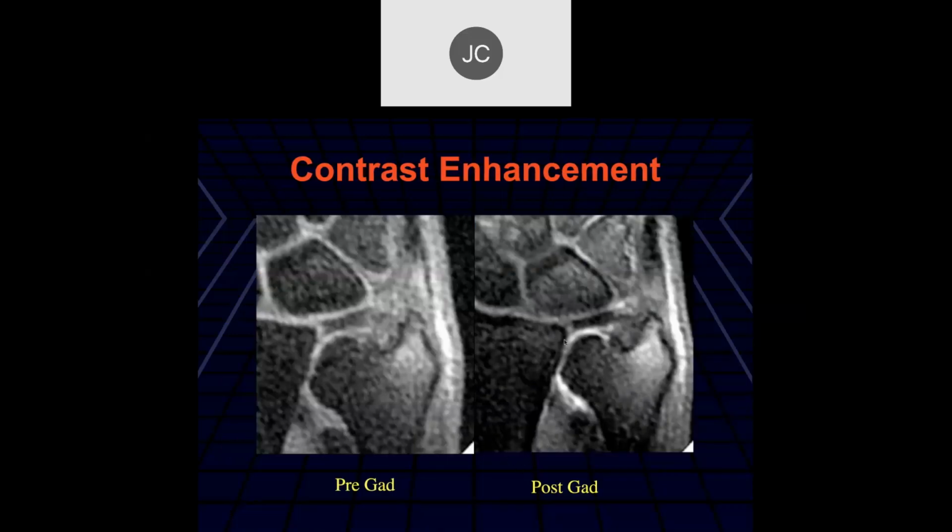And very early on, you can actually see these changes better with contrast than with non-contrast studies. In the EULAR, which is European League Against Rheumatism, a lot of their studies that were published a few years ago, their recommendation was that you could use an abbreviated MR technique, which had only 3 sequences, one of which was a post-contrast T1-weighted fat suppressed sequence, and they thought that was the most sensitive for detecting erosive changes because they tend to enhance avidly by contrast.